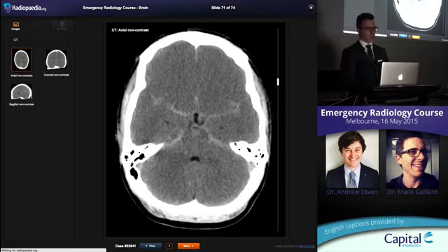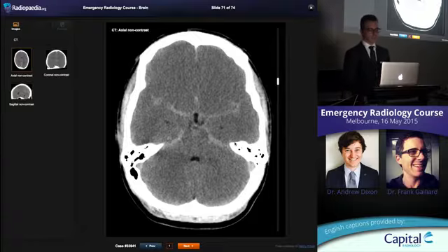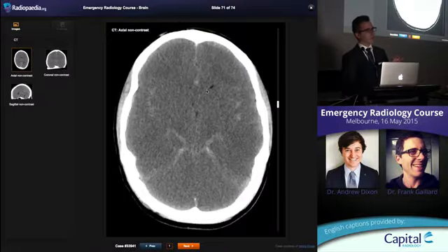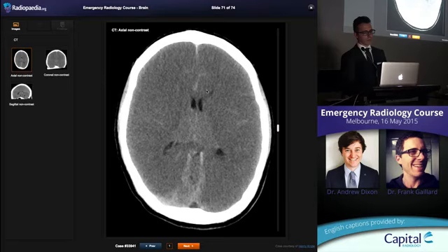When you look at this, the first thing you might think is that they've had a massive subarachnoid, because all the branches around the circle of Willis are bright. This is actually what we unimaginatively refer to as a pseudo-subarachnoid sign. These are exactly the right density, it's that the rest of the brain is low density. Remember, you have to be able to see grey and white matter as separate densities on a normally windowed CT brain. So if we try and identify a single structure, other than maybe the thalamus, everything's gone.